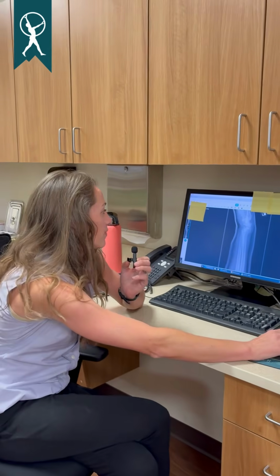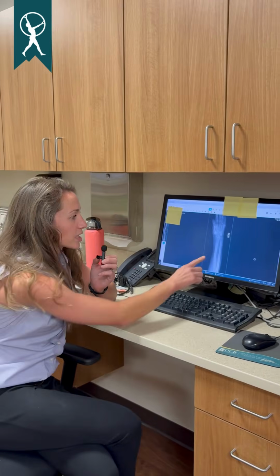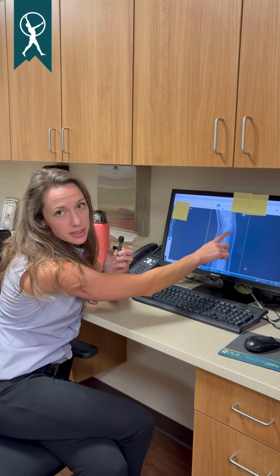I'm going to talk to you today about one of my favorite things, which is wrist fractures. This is an example of a distal radius fracture. This occurred in an elderly woman, and what you can notice from the x-ray is shortening of the radius here relative to the ulna, and that the hand bones are falling backward with the fracture fragment.